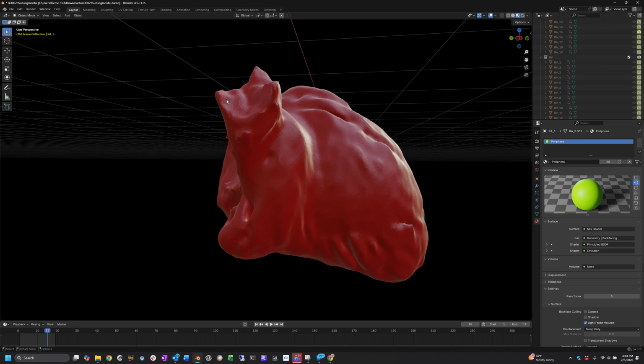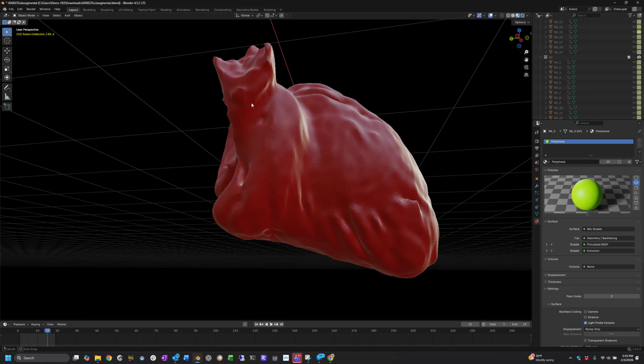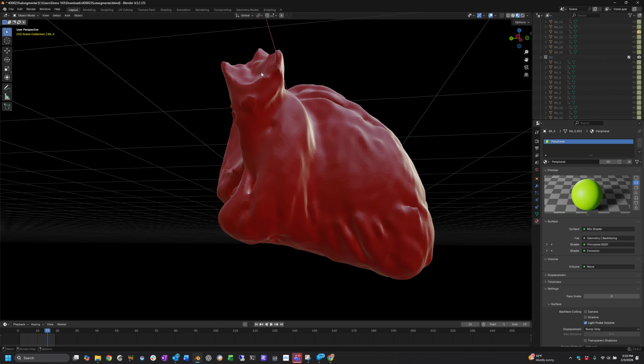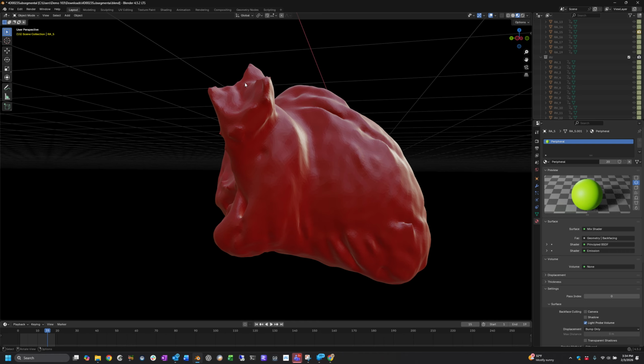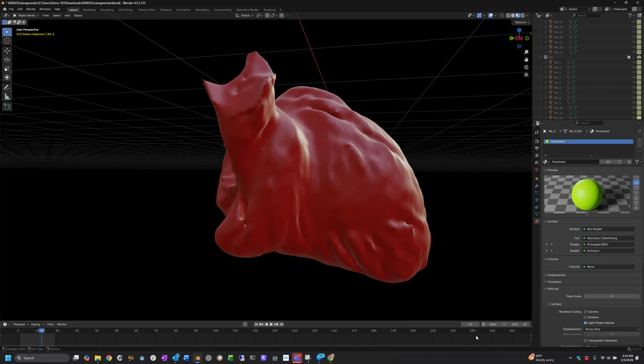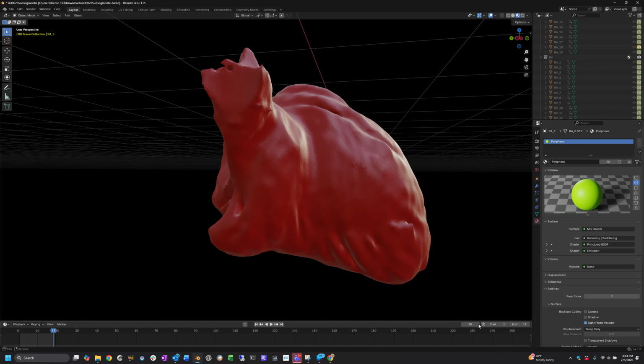This one, it looks like it was, and again, see how this is lumpy? I think this is one where the cut was made where the actual valve was rather than that 3D method. But because this one looks so close to how these are looking here, I think that confirms that our sort of cheat code for doing that is pretty good. And again, this is just for subsegmental.